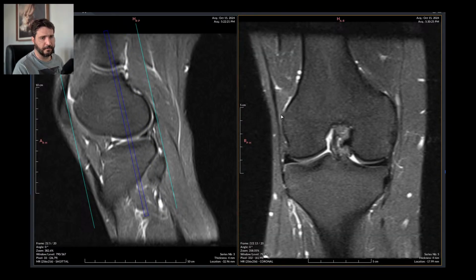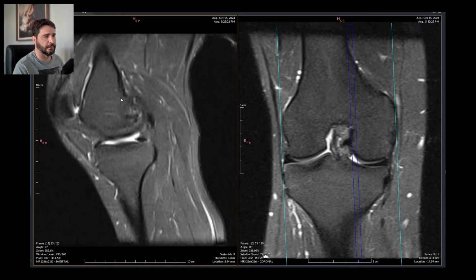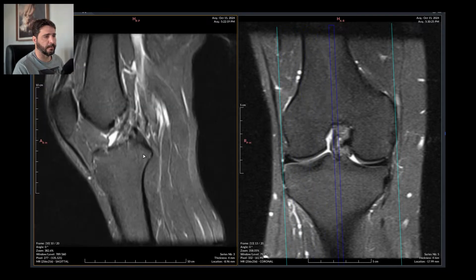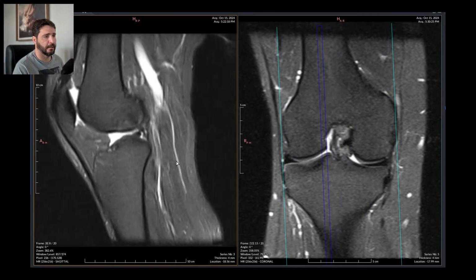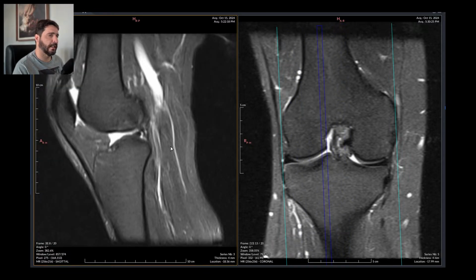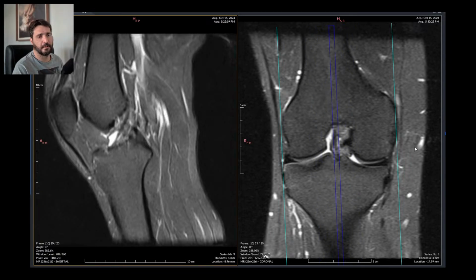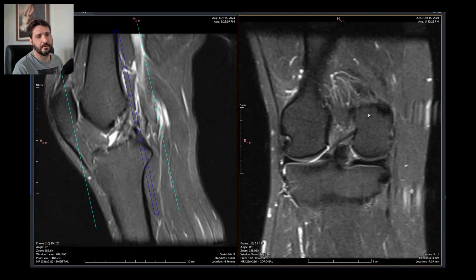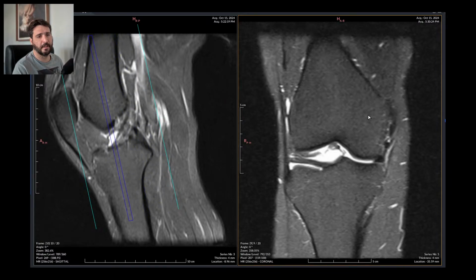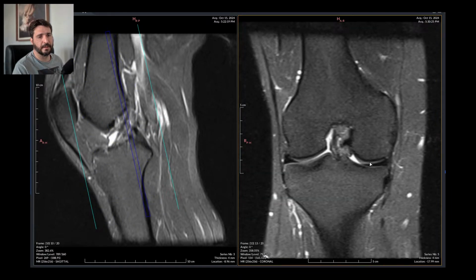This is a coronal PD with fat saturation, and this is a fat saturated sagittal PD. So the resolution is still very low. The meniscus aren't really properly imaged, but we can say a bunch about this image. This is probably a newer kind of a low field scanner because resolution isn't good, but saturation is. So sounds like a well calibrated crappy scanner. So meniscus fine.